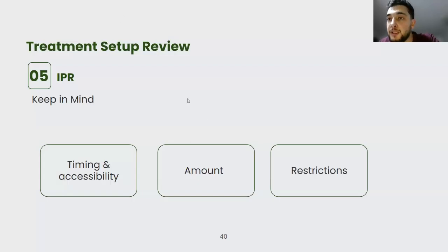Also, I need to check for the amount. If I do too little interproximal reduction, I'm gonna get loss of tracking and unfavorable intrusion on teeth. So I always say getting residual spaces is always easier to fix than having no spaces. I always go a little bit more to the safer side, and I go for more interproximal reduction, because if I end with residual spaces, I can just fix that with a refinement of 5 or 6 aligners, retract the teeth and close the spaces. But if I don't have enough space, I'm gonna get loss of tracking, and I'm gonna need a mid-course adjustment, and sometimes I'm gonna get intruded teeth that are going to be difficult to fix.